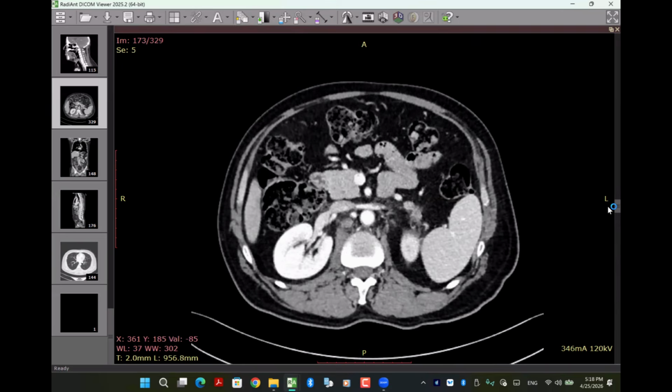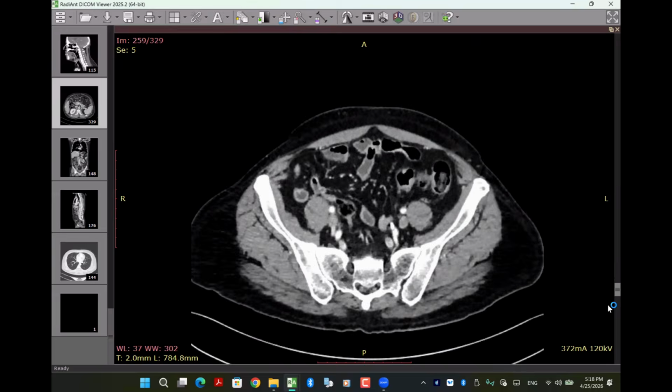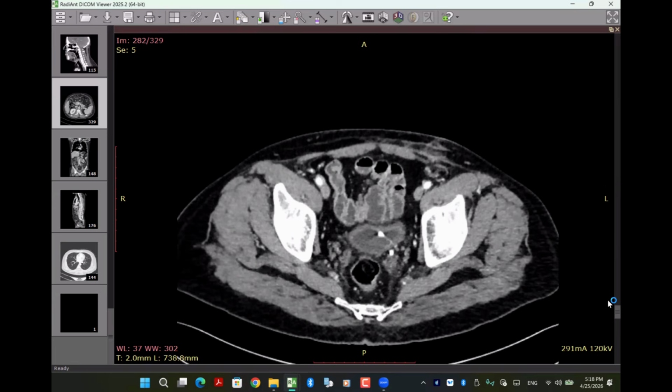No, sir. So if you found inguinal and internal iliac lymph nodes in that case, and they are also having similar consistency of infiltration, what do you think? Is that direct extension, or is this infiltration of the?